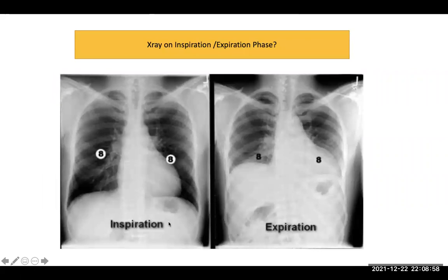Okay, so starting to read an X-ray, we first have to find out whether this chest X-ray has been done in the right way or not. Firstly, you have to look at whether the X-ray is in the inspiration phase or the expiration phase. It is very important. As we know, in our country, and also in other third world countries, not all technicians are good enough, and they have no proper technique or training on how to do a proper X-ray. For this reason, they don't know at which time the X-ray should be taken.